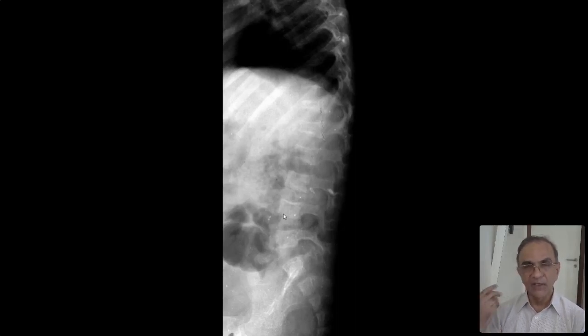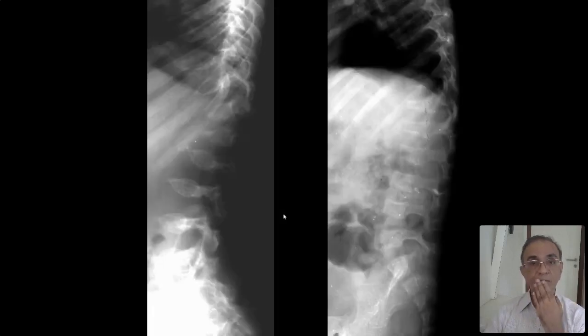Okay, so I'm telling you so many examples of 100% diagnosis. I'm not making it up. I'm not making it easy for you. It's how it is. Some of these common skeletal dysplasias present classical findings which you can make a diagnosis of on 1 or 2 radiographs. Oh yeah, I got a comparison here. Lovely. So on your left is an MPS, on your right is osteogenesis imperfecta. Look at how different the vertebrae are.